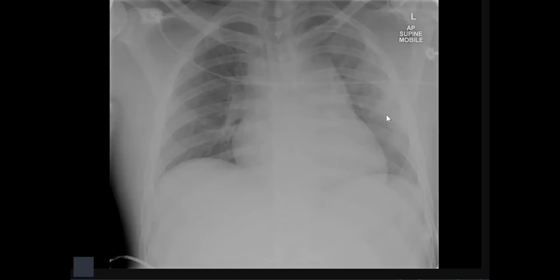Percolated blood, maybe along the bronchi. Pulmonary contusion. So we are suspecting mediastinal hematoma and some pulmonary contusion, with no rib fractures and no bony injury. I am also seeing the sternum and the vertebrae for any bony injury.